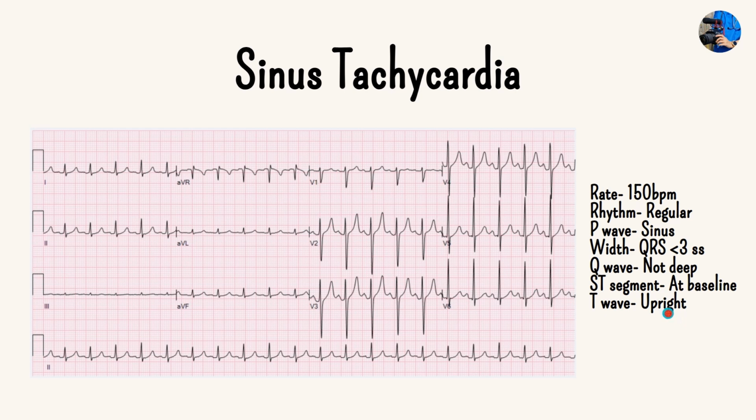Therefore, because there's no other abnormality on this ECG, and we've got good R wave progression as well, you can see that the R wave gets taller and the S wave gets smaller from V1 to V6. There are no elevations or irregularities, and therefore we can call this a normal sinus tachycardia. I know we're not going into much of the pathophysiology, but really this would be something that you'd see if you did 10 star jumps right now.